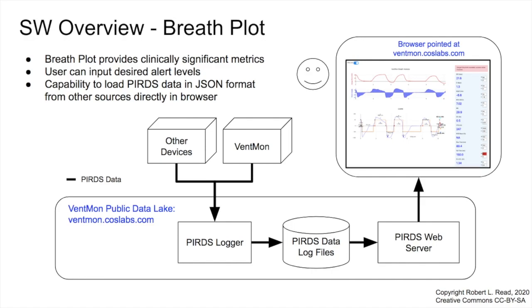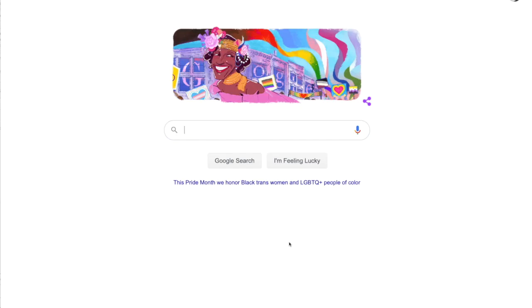BreathPlot is another key component of VentMon that provides all the clinically significant metrics you'd expect to see in a ventilator. Rob's going to talk a little bit more about that. Hi, this is Robert L. Read, demoing the BreathPlot software, which is used with the VentMon device.